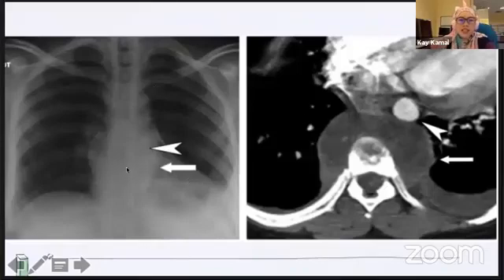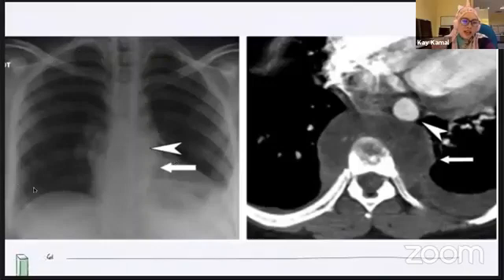So in cases like this, usually you have to be very wary, because most of the time this retrocardiac region is the place that you miss looking. You remember I taught you last time that we have a few places that we must remember to look at, which are our review areas: the apices, the diaphragm, the CP angle, and also here. So this one, if you don't look, you might miss it. In this case, it's actually a paraspinal abscess, usually from TB and things like that.